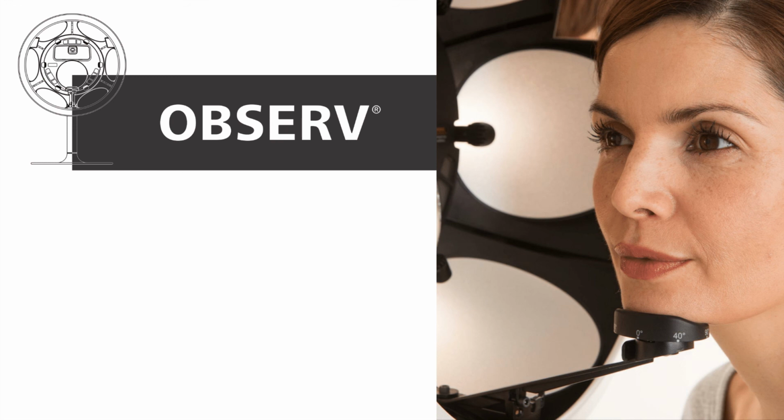Where the OBSERV 520 is widely used as a standard step in skin consultations and is often used as a dermatological tool, the integration of the AIS will create a consultation flow as it intuitively guides you through the consultation, allowing you to analyze and mark skin concerns in detail and linking them directly to your product or treatment range. The communication with the client becomes even more visual, which in turn will lead to increased sales in products and treatments.